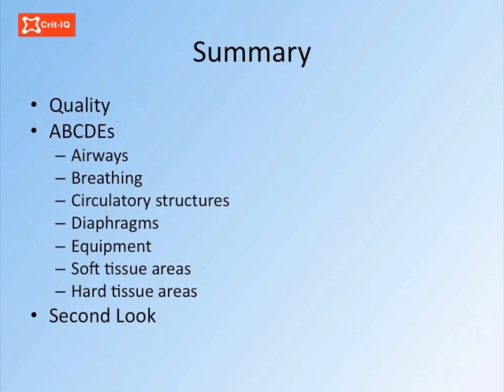Soft and hard tissues outside the thorax should be carefully examined, and a final review of common places for missed pathology conducted. A structured approach will maximise the information that you can gain from this vital examination. The videos that follow this one will review common pathology found in ICU chest X-rays.